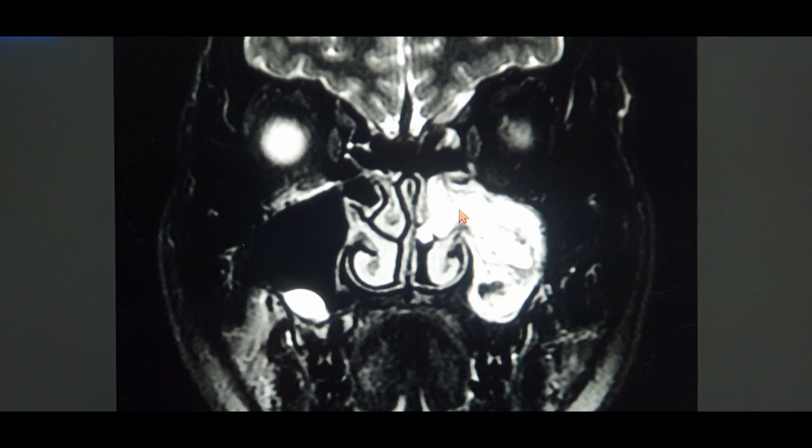Also, the third point of the importance of MRI is this: when you're doing surgery in cases of inverted papilloma, taking a surface biopsy is of no use because it's going to be polypoidal in nature. You have to take a deeper biopsy, and the place for taking the biopsy you can know for sure from the MRI itself. I can see a lot of CCP patterns over here. They are arising from this region and going away towards the nose area. So I think this is the main area from where the tumor is arising, and I should take a biopsy from this place, which will be more valid for my biopsy.